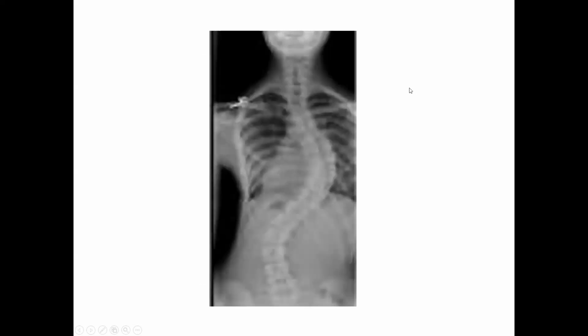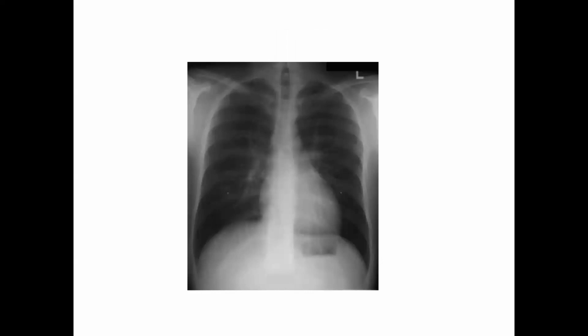In this particular film, if you work in respiratory therapy long enough, you'll see some aspects like this. You can see that this patient's spine has scoliosis. You can also see how it could become difficult when we look at obstructive versus restrictive disorders, portions of the lung based upon anatomical configuration, how difficult that might be for your patient to breathe, or why it might make them more susceptible to atelectasis and consolidation on one side of the chest versus the other. And then we will finish up with this particular film, which should be a normal chest X-ray.